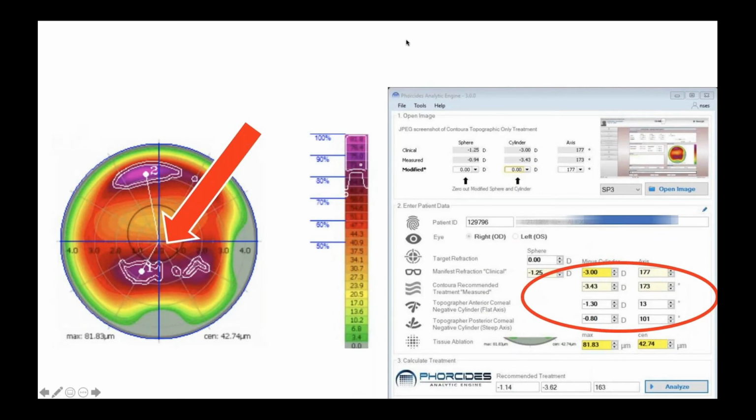We're going to go through some live cases in just a little bit, but before we do that, a little bit of an explanation on why we need this secondary device. I get a lot of questions, Mark, why do I need a Pentacam or Galilei G4? There's a couple different reasons for it. The first reason is we need to know about that posterior cornea.